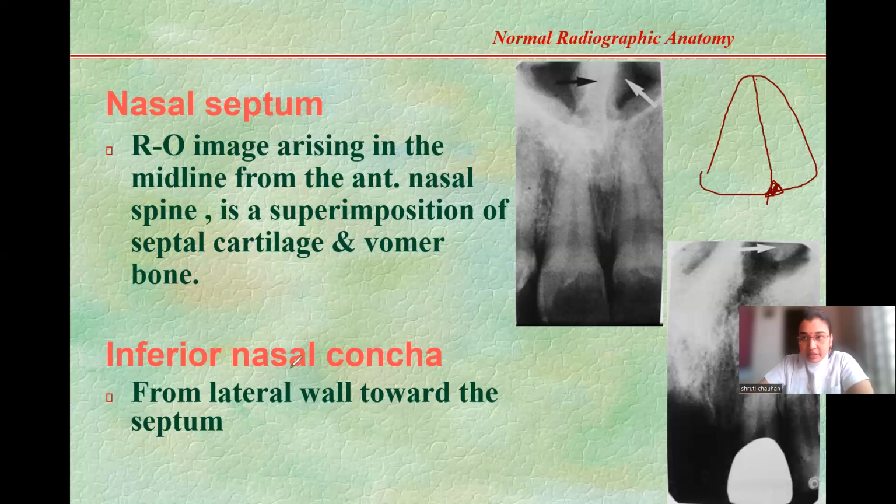Then the inferior nasal concha. What are nasal conchae? These are these extensions over there in the nose. You remember, like this. Again, anything extra that we are seeing in the nose, how will it appear? It will appear as white, radio-opaque, right? We cannot see this because we are taking an IOPA. IOPA will be limited till max here, unless you go so wrong that you take an X-ray here. You're not taking an X-ray of your nose, right?